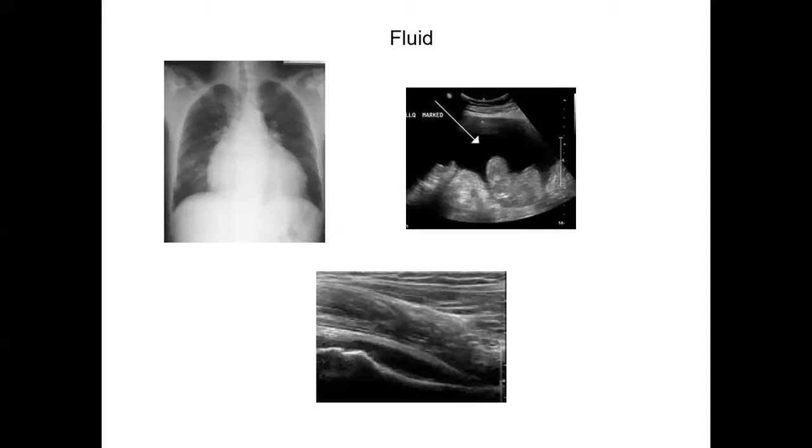Now, if we go below the diaphragm, here's an ultrasound image of ascites. Here's the bowel, here's the dark, this is fluid, this is ascites, this is fluid again. And how could we describe this fluid pathologically? Well, it's either a transudate or exudate. And if it's a transudate, we'd be thinking about liver failure, a small shrunken liver, large spleen, we may find. We'd be thinking about renal failure or heart failure, and low oncotic pressure, exactly the same differential because it's fluid, it's low in protein, a systemic problem. If it's an exudate, again, the same differential. It's either infection or tumour.